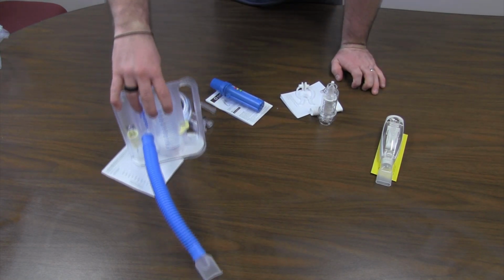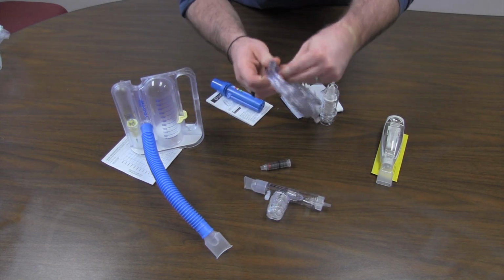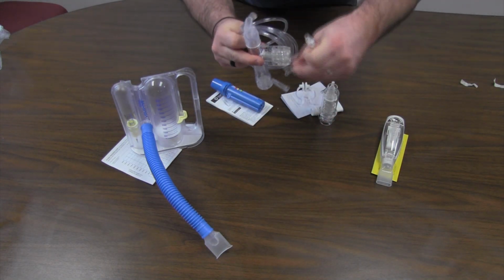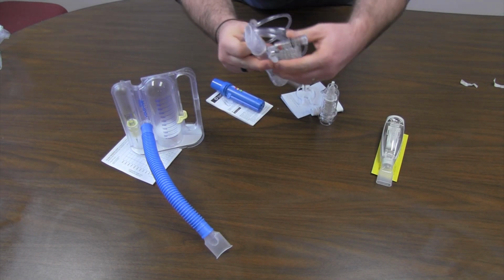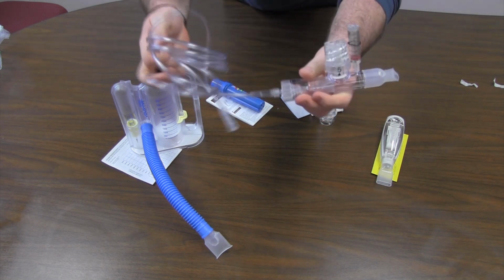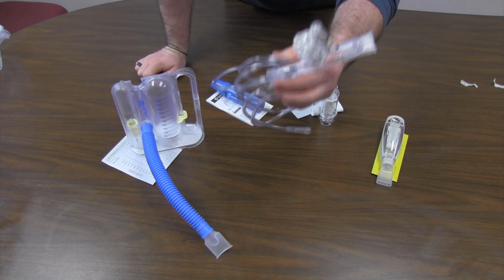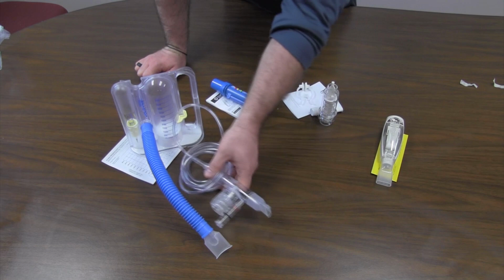Second device I'm going to show you is this one here. This is called an EasyPAP, also known as an AccuPAP in some cases. This is an incentive spirometer on steroids. So let me explain a little bit about this. It's going to look at something like this. It's going to hook up to a flow meter, and the patient's going to blow in this side. I'll do a demonstration on that in a second. But that's going to also help to recruit alveoli and help with oxygenation. So let's put it over here with the spirometer.